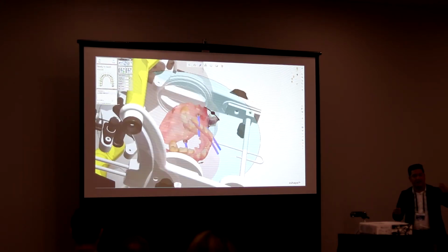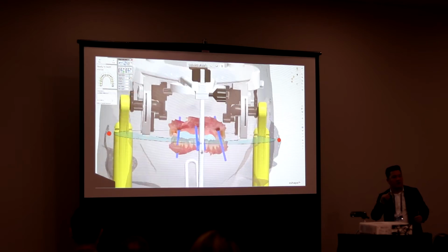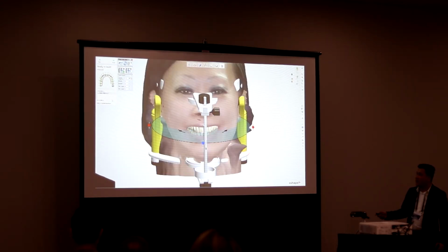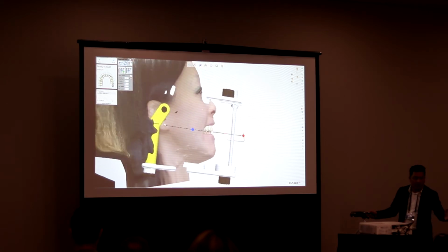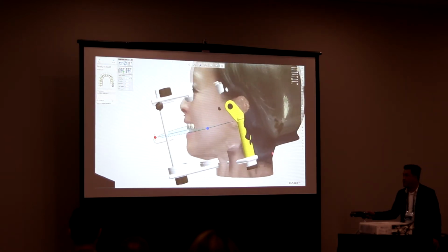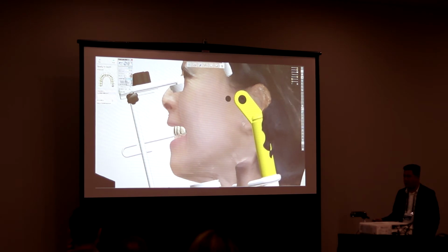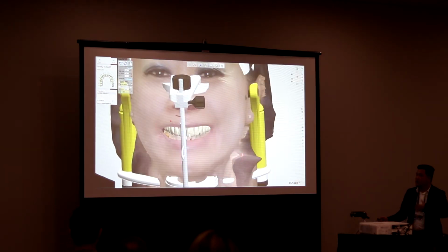So rather than setting up as gingiva and having it tell you, oh, there's a hole here or there's an error there, you just set it up as a really big pontic. Temporary prep doesn't care. You just set it up, put it there, and it's all nice and connected. Again, I did this design probably in about 20 minutes. And we send this off to the doctor.